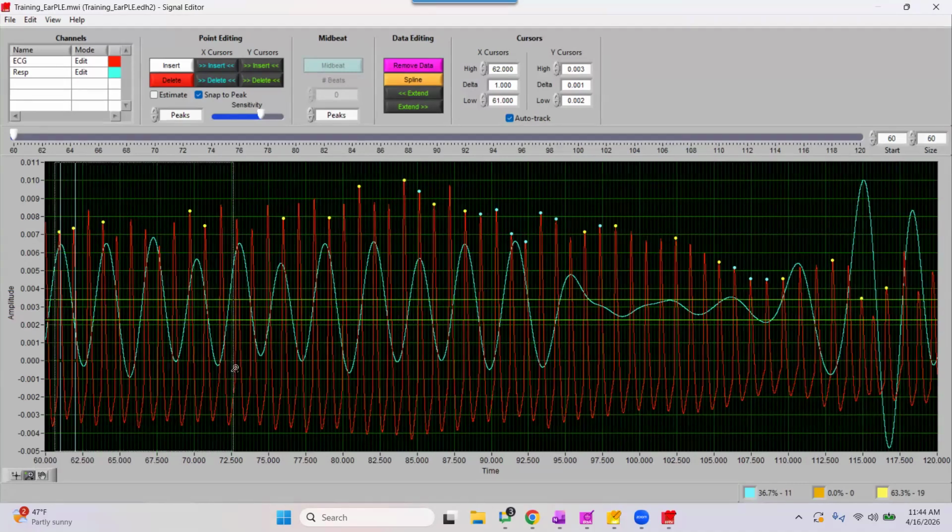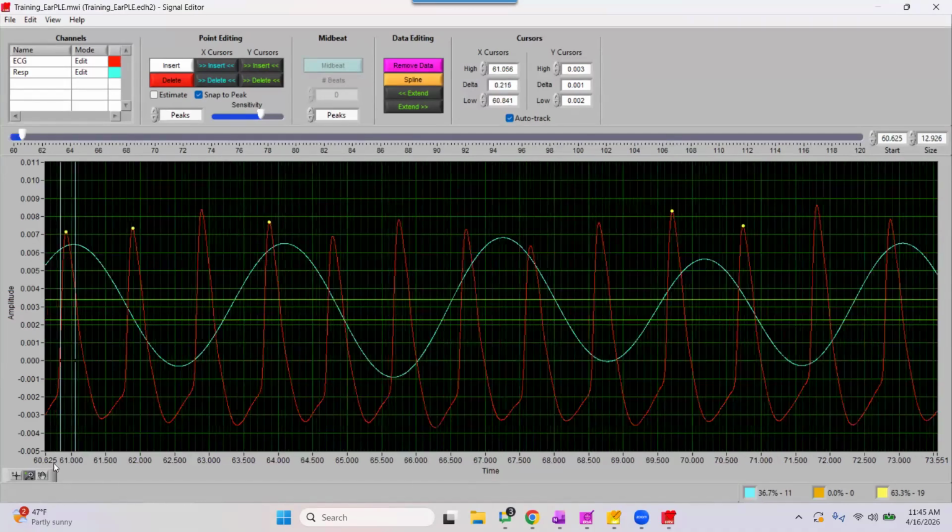So I'm going to zoom in on my x-axis and click and drop about a 10-second window. And with that, I'm able to get more information and more details about the waveform. And this looks pretty great to me. We've got, again, this pulsate waveform arrival, systolic peak, and a fall off.